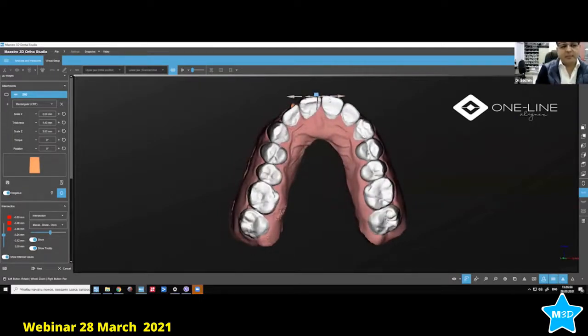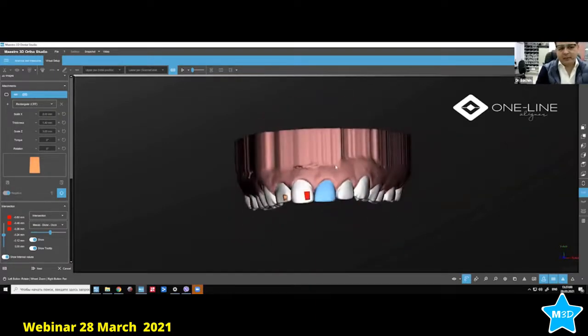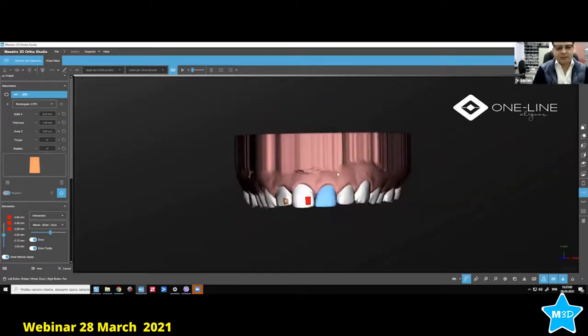The problem with these will be that when you print the models, you might get some errors, or you might get a bigger hole than you actually planned for. I do use them rarely, when the patient does not want attachments on the front, or I prefer to use pliers for doing the indents.